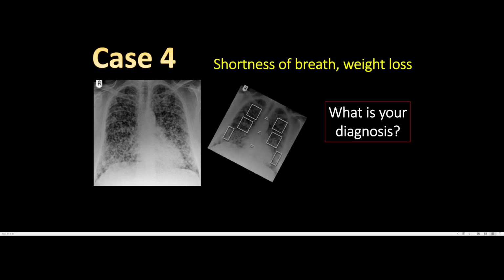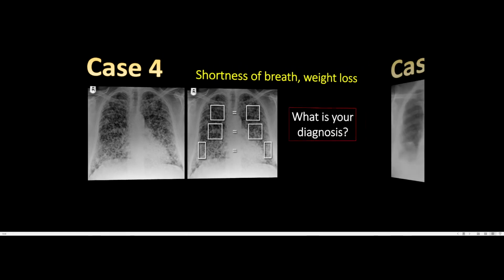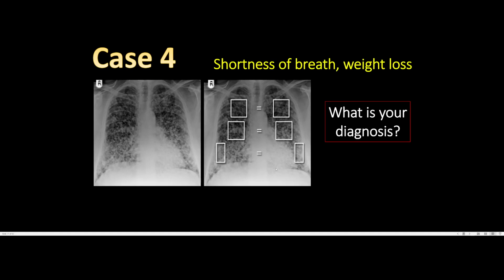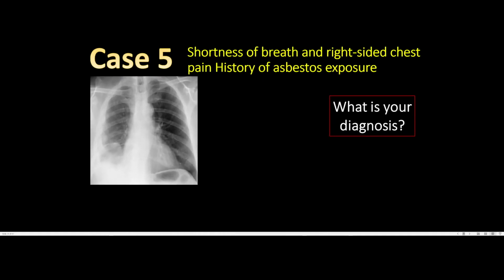So again, the patient's history and the patient's chest x-ray come together and match up with one another. You can see the presence of multiple pulmonary nodules spread out, giving you a whole bunch of differential diagnoses. All right, we cannot assume otherwise. And again, if you want to localize the differential diagnosis here, you'd order a CT scan to visualize your findings as well as localize your findings, their location. So let's look at the next case.